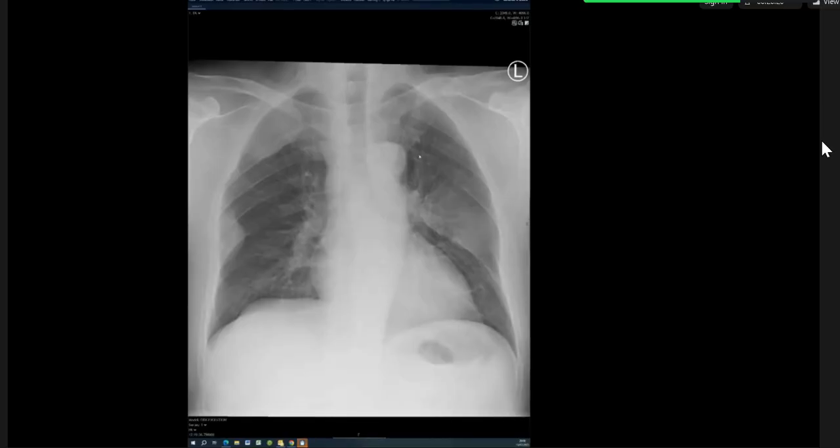And in that case, there would be a wide range of differentials, depending on the patient's age. So yes, this could be a primary bone tumor as well. I don't think it's an infectious cause, and I'm not suspecting any other non-sinister pathology in this instance.